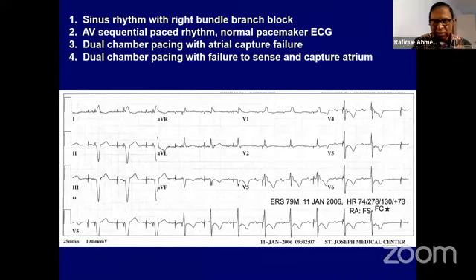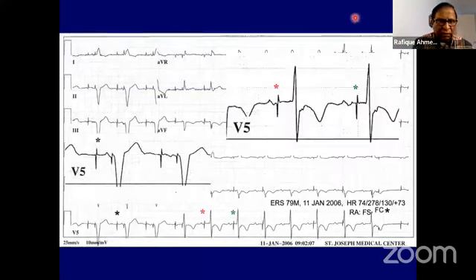So this is better. I think both C and D. C is partially correct. I'm going to enlarge this ECG. Look at this. If you look at this one, I don't think there is any capture. But over here is different. There is a P wave. So it's intermittent capturing in the atrium, number one. This one did not capture. This one did capture. Here is sensing failure. Now, one possibility that Aziz was mentioning: there is a P wave.